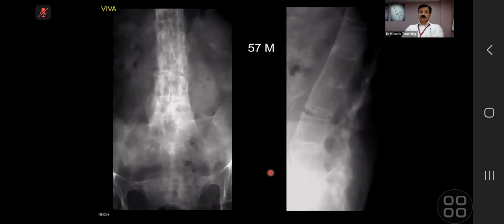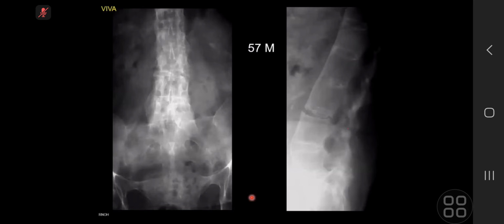Over to candidate 5. I'm presented with frontal and lateral radiographs of the lumbar spine of a 57-year-old male. There is ankylosis of the sacroiliac joints bilaterally and extensive spinal ankylosis with syndesmophyte formation, causing the appearance of a bamboo spine. In the lateral radiograph in particular, it is evident that there's a transverse lucency passing through one of the syndesmophytes, which appears to be in the lumbar region.